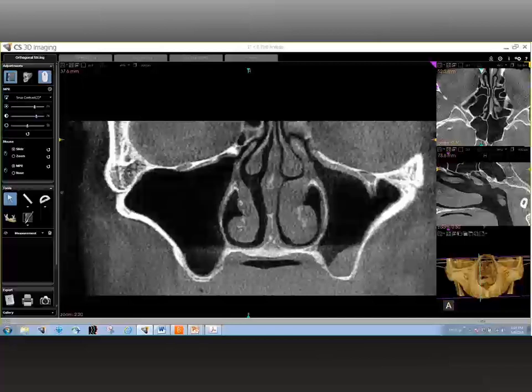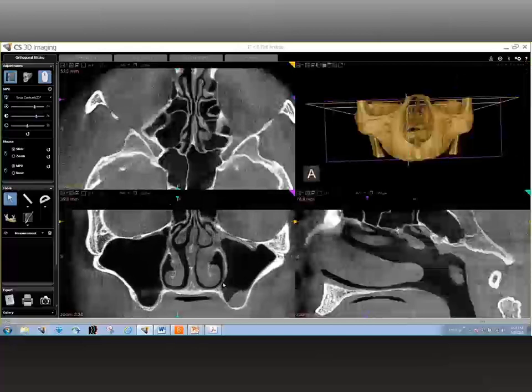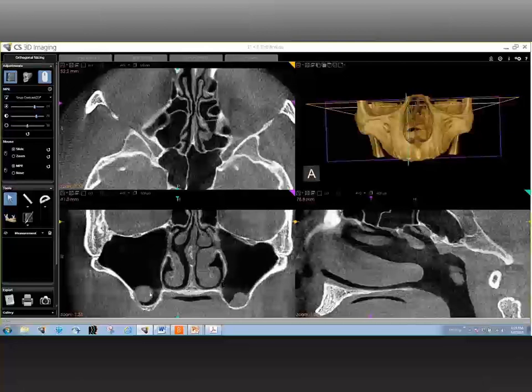Well, I think, Jordan, you're referring to what you're seeing in the sinus right now, the little bit gray area that you see within the sinus. Yeah. That is a good question. Now, if you notice, it's actually bilateral. When we move the scan, you can see that it's not just on the left side. You can also see it on the right side. Now, of course, in this case, it just looks like a polypoid-like lesion on the right, maybe a little bit of exaggerated mucoperiosteal thickening on the left. Now, it is important to note that there's always some part of a mucoperiosteal layer that could be a little bit inflamed due to the non-sterile nature of the sinus by itself. But something of this nature probably should be of a little bit of a concern.